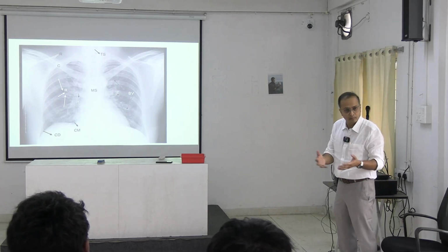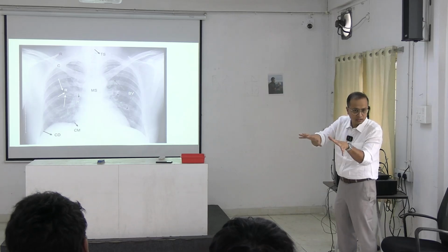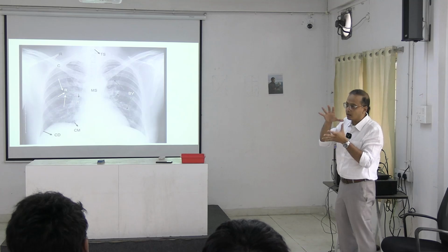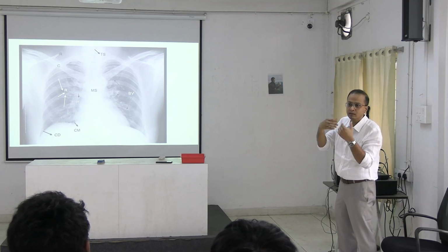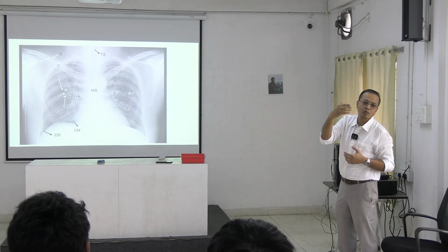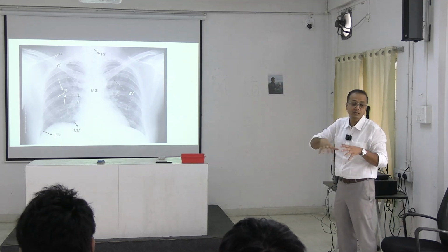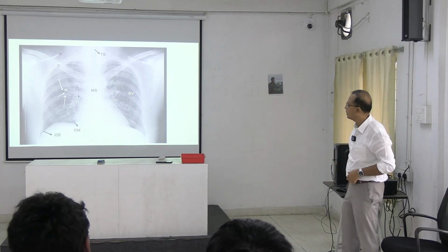That is a normal thing, right? Because the bigger vessels branch into smaller branches. The bigger bronchovascular blood vessels and bronchus make a good impression. Once they become narrow and small, the images of the bronchovascular markings become thin. That is why, moving to the lateral side, it becomes more black than white. So, these are the normal shadows that you are looking at.